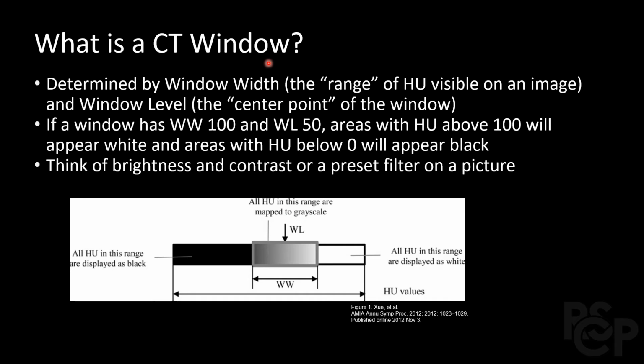Now that we have a basic understanding of how CT works, let's move on to talk about windows and how they're relevant to neuroradiology. I like to compare windows to filters on a picture. So let's say you take a picture, right? You can either modify it manually by adjusting parameters such as brightness and contrast, or you can just impose a preset filter on a picture to highlight specific qualities that you want to bring out.